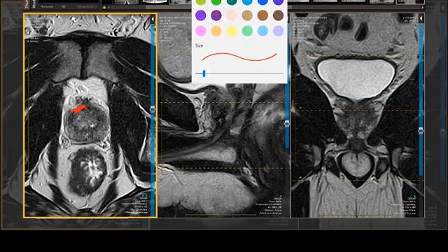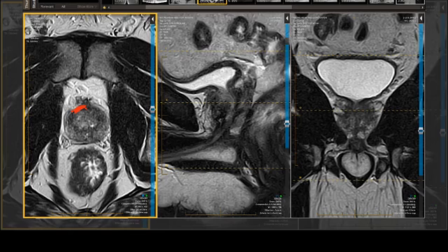And let's take a look at the central region of the prostate gland, which consists mostly of the TZ. And then this patient's peripheral region, not as hyperintense as you would usually expect. And we're going to see how that plays into our RADS grading, but let's color over it. So we're going to color over it right now. I'm going to make that blue.